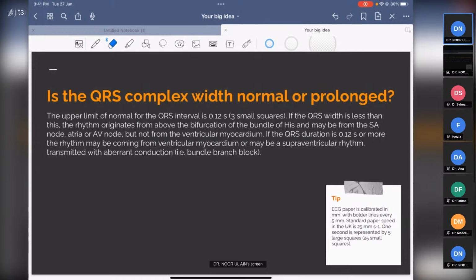Again, QRS complex, and it's a very big classification. It's a rule. Once you understand this, you will really pick up everything. When the QRS complex is narrow, you see "narrow complex tachycardia" written. Narrow complex, which complex? QRS complex. Narrow means what?